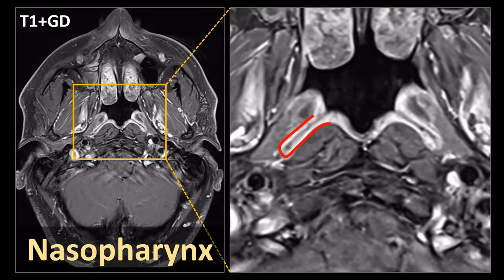the important structures of the nasopharynx, that you immediately recognize that this is the nasopharynx, because we see here the typical Torus Tubarius, here the impressions caused by the longus capitis or colli muscles, and that you immediately recognize Rosenmüller's fossa, located posteriorly of the Torus Tubarius and the predilection site for nasopharyngeal carcinomas.